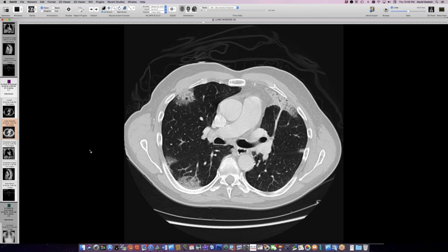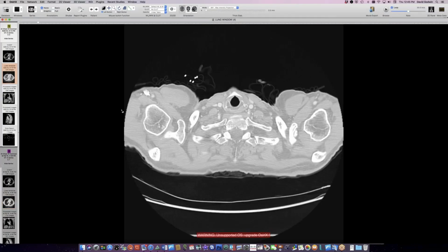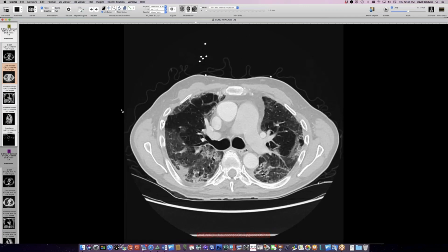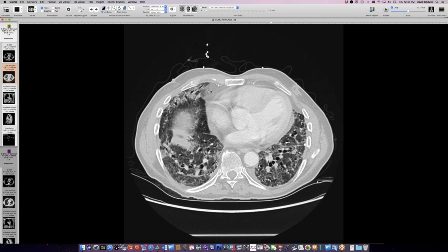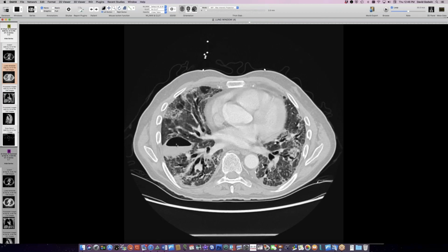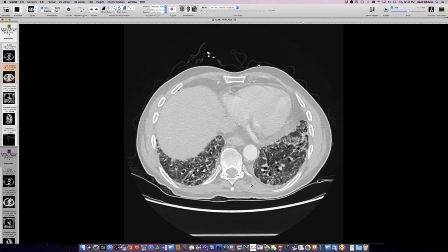And this person now has rapidly progressive interstitial lung disease. So current CT looks like this. This is this month now, just a couple of months after. We've got a lot of peripheral reticulation and ground glass abnormality everywhere. We do have, I think, a pleural thing here in the fissure, some abscess maybe in the fissure, or I think there was blood in this thing, and I don't know whether that came about because of a biopsy or what. But now I think we have an NSIP pattern. So in a couple of months, our organizing pneumonia pattern has evolved into NSIP.